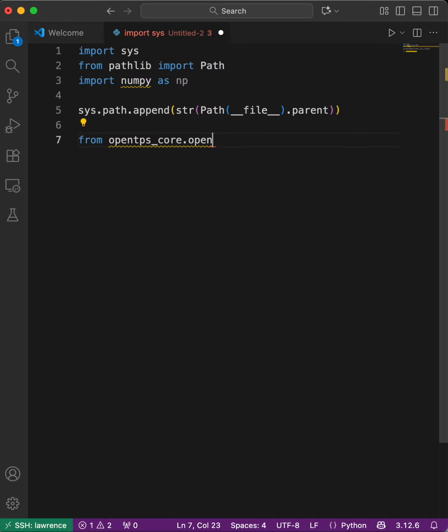Many core, something MCsquare, I forgot the full form, I have to look it up. Yeah, so MCsquare is the dose engine, or the algorithm which calculates the dose and verifies it.